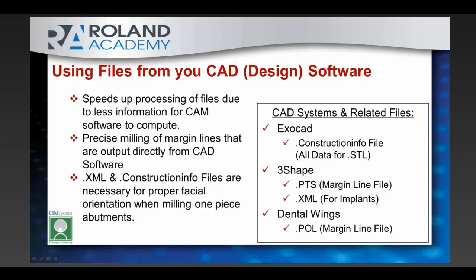So it's a lot harder for the software to detect it. It also takes a little bit more time because the software has to try and detect those. So if we use these additional files from the CAD software, it automatically tells us where you designed the margin, and it takes all the legwork out of there, so the CAM software doesn't have to automatically detect it.